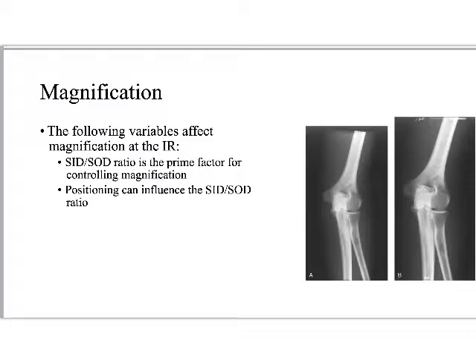So I've positioned it further away from the image receptor and in a sense magnified it out, so there's less detail there on the thoracic spine, more detail with the heart, right? If I wanted to see the thoracic spine, I would have the patient positioned for an AP projection, right?